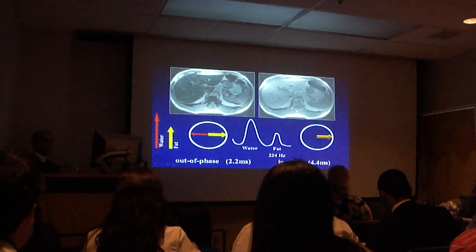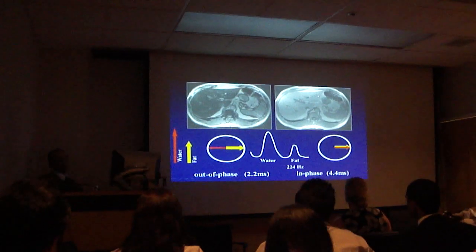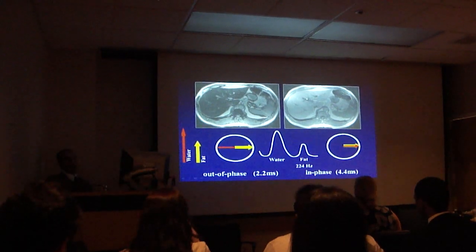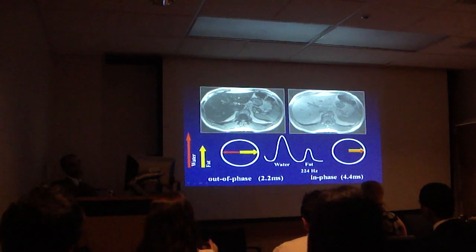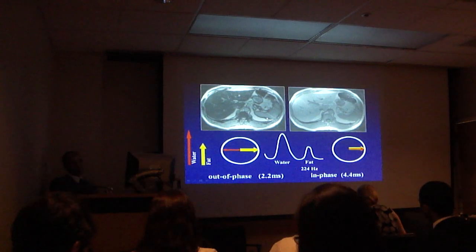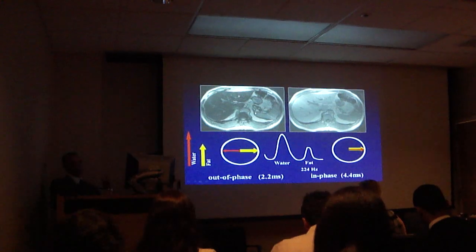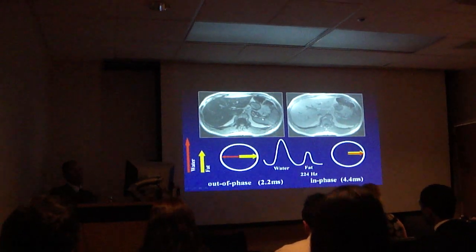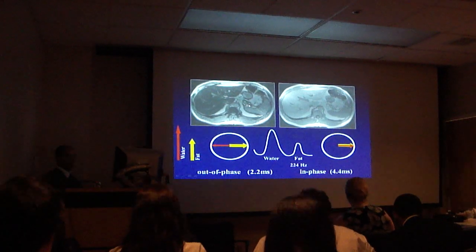As you can see, this is the exact same patient. Here you've got liver and you see vasculature going through it, and on the in phase you can't tell whether the lesion contains fat or not, but here you can see there is complete dropout. This liver has diffuse fatty infiltration. Also on opposed phase, wherever there is fat and water, tissue that has significant fat and significant water, you can see dropout of signal as indicated by this black line around the organs, India ink as it is called.